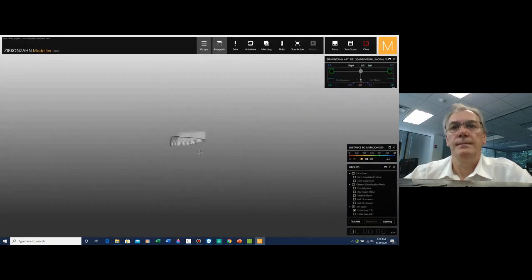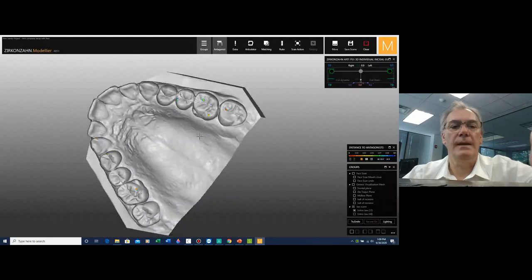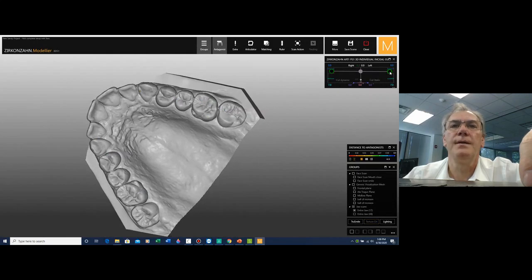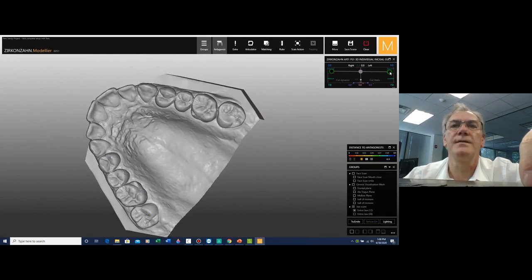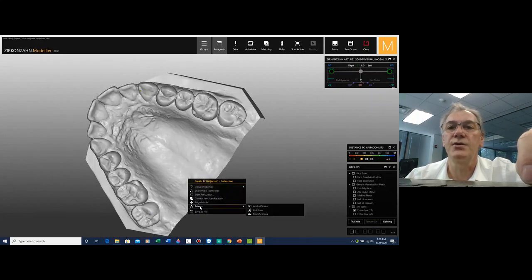There you are. Let's just check it out quickly. And let's go. 1, 2, 3, 4. It still takes it. 5, 6, 7, 8. Yeah. We gained a millimeter and 2 millimeters. We gained 2 millimeters, so it could be that by eliminating 2 millimeters on this angle, extra, modify scans, I can re-bring the function on that canine.